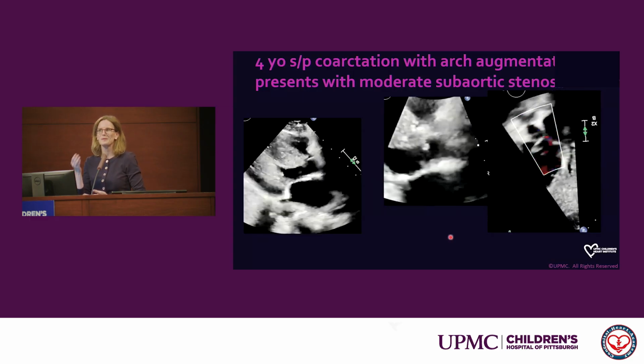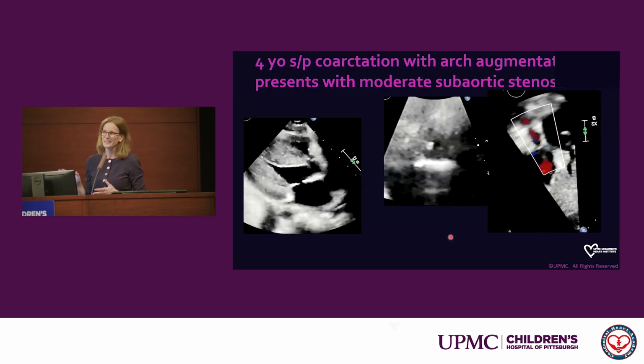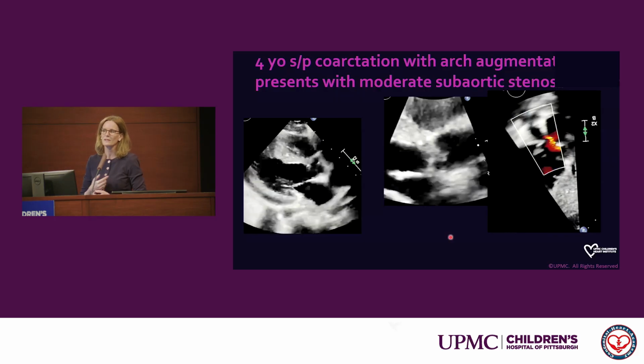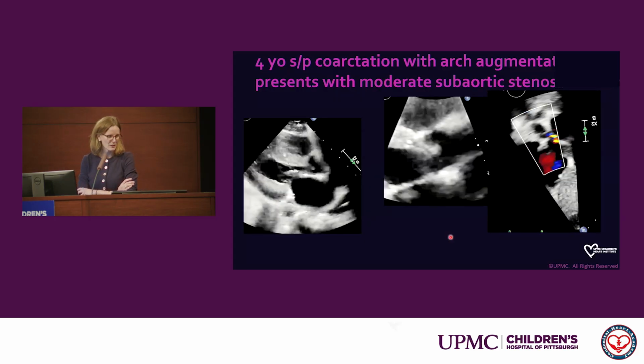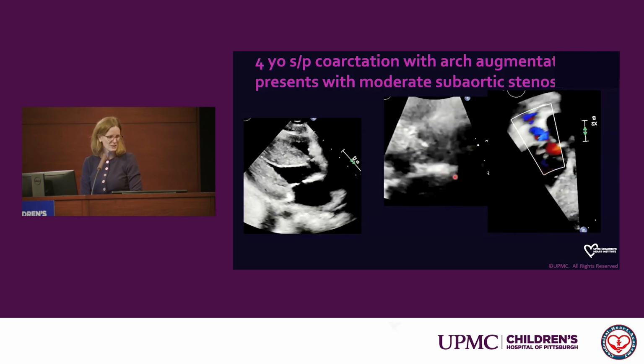And it's interesting, similar to the case Dr. Lamford presented, this child had a totally clear LVOT as a neonate, an infant, and then this fibromuscular stenosis that can be seen here was more recently acquired in toddlerhood, in the preschool age group.